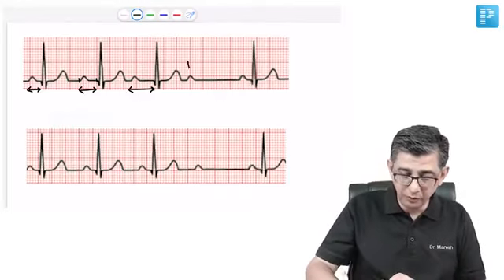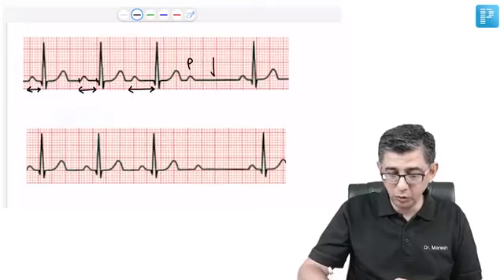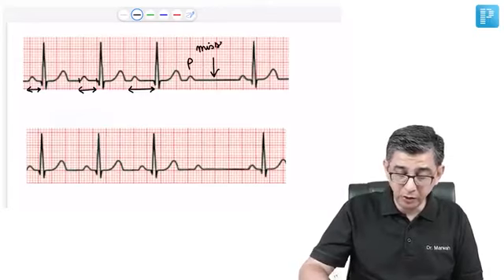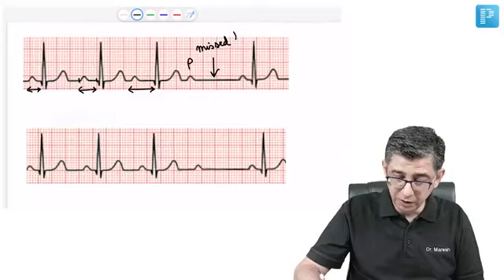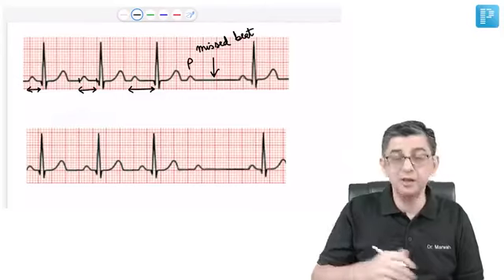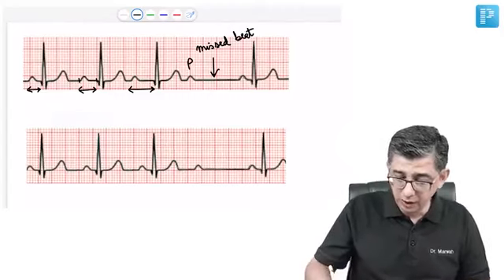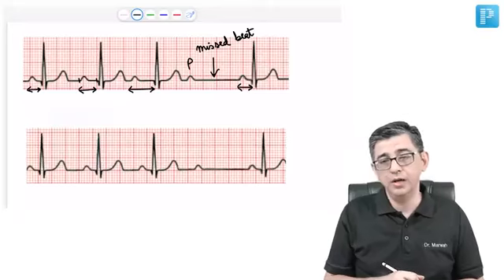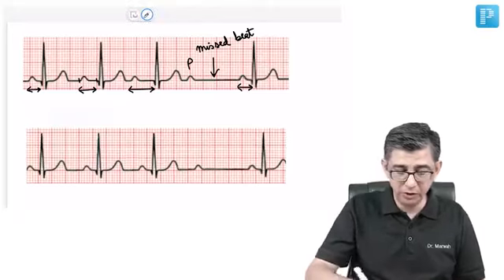And then you can notice a P wave, after which I'm waiting, but there is no QRS complex. So at this point of time, the person might even put his hand on his pulse and say, sir, suddenly my pulse disappears. So I'm describing a condition where there is a missed beat experienced by the person who is feeling his own pulse. Subsequently, if you look at it, there's a reset in the rhythm of the heart, and the PR interval of the patient will become almost identical to what it was initially.